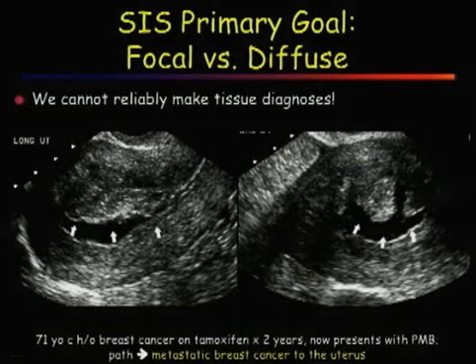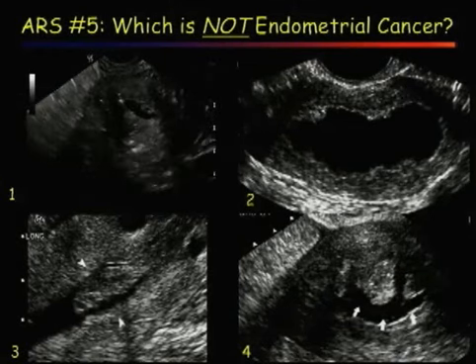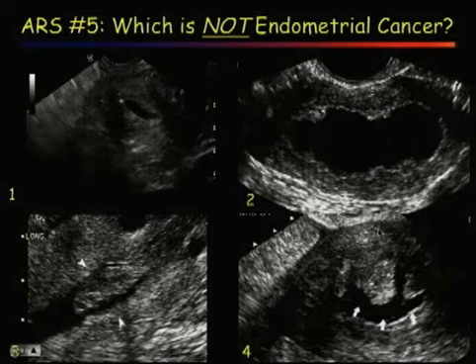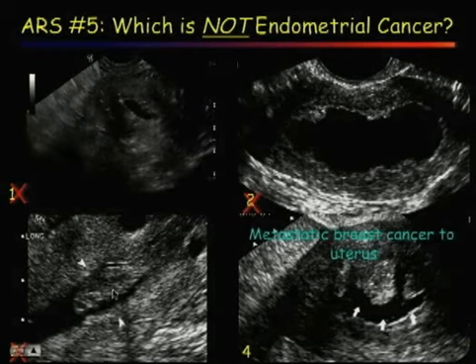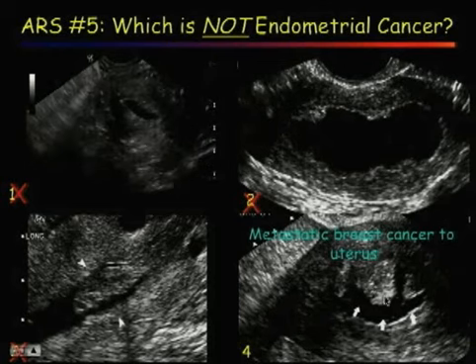Then you look at this one, lobulated, hyperechoic, irregular. This is a classic appearance for endometrial cancer. Turned out to be breast cancer metastatic to the endometrium. So we can't make path diagnoses. So which one of these is not endometrial cancer? And you can see multiple varieties right there. But these top two turned out to be cancer. This was cancer in a polyp, and this was breast cancer metastatic to the uterus.